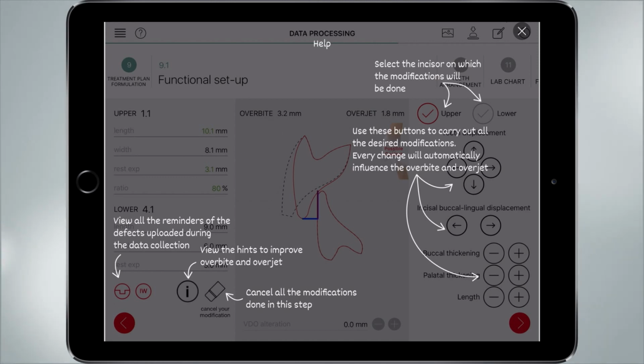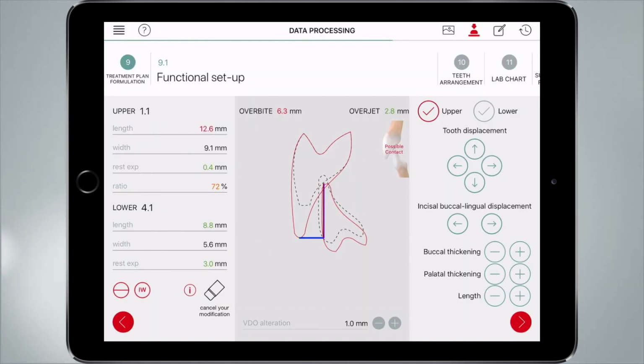That is not only shown in this screen, but is shown in other screenshots, not just in this one. So this one is one of the screenshots where you can find all this information. This helps you a lot, incredibly. So going back to the main screenshot.